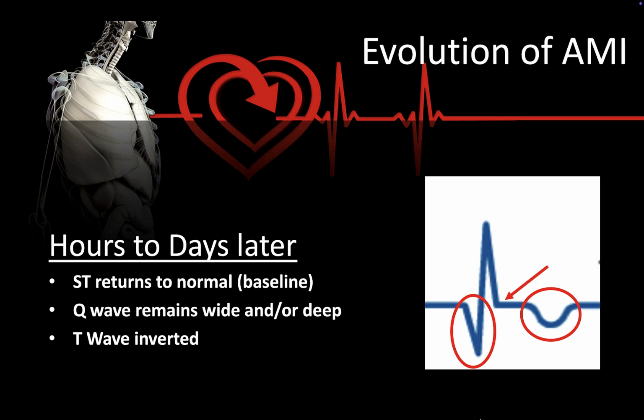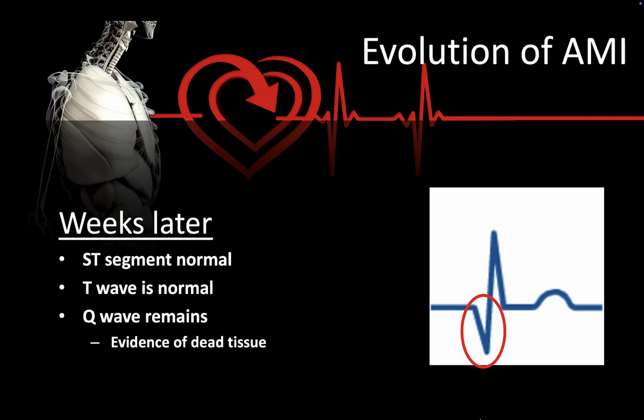Hours to days later, we may see some changes. That ST segment may go back to normal, back to baseline. The Q wave remains wide or deep, and the T wave may be inverted or odd in appearance. And then weeks later, the ST segment is normal, the T wave returns to normal, but that Q wave remains.